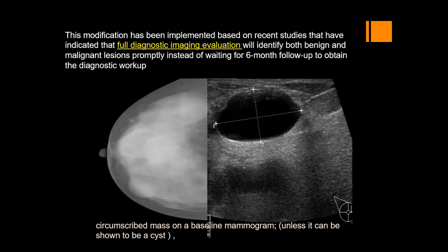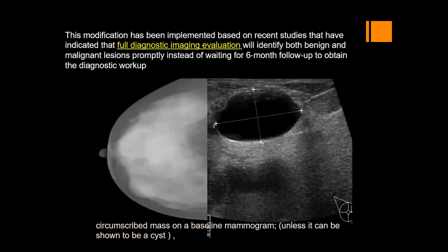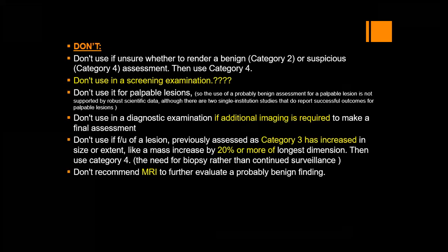Try to clarify, do spot magnification view, do compression view, do ultrasound, okay? And then either downgrade or upgrade the lesion. If you could not upgrade it or downgrade it, then you can code it as BIRADS 3. So don't use BIRADS 3 if unsure whether to render a benign or suspicious assessment, then use category 4. Don't use in a screening examination, as we said, don't use if palpable lesions. This is a new recommendation. The new recommendation: don't use BIRADS 3 for palpable lesions.